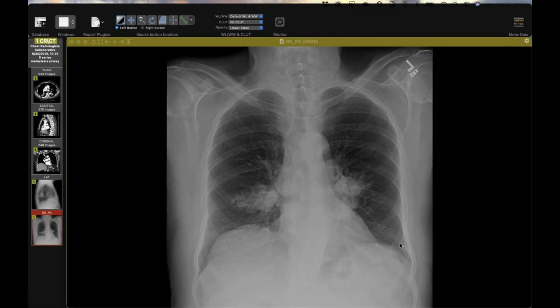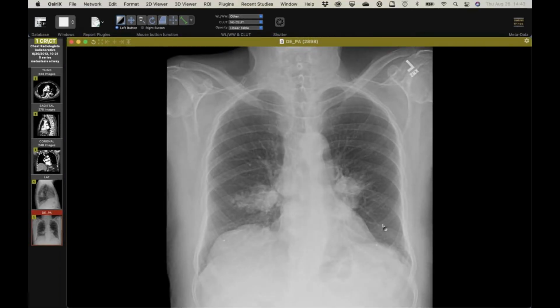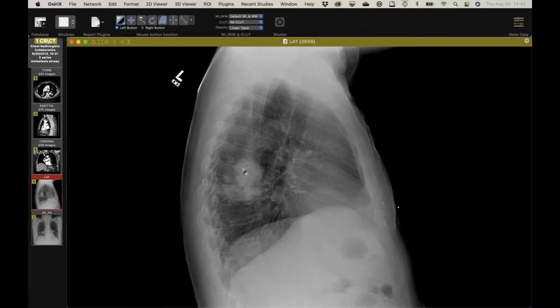All right, you see a chest radiograph here. So this is an elderly person who presented with shortness of breath and abdominal pain. Don't remember all the details, but you can see the frontal radiograph is very abnormal. There are these bilateral perihilar masses, very discrete, sort of branching from the hila, almost look like lymph nodes, but a little bit more irregular. And then on the lateral, you see it's flipped backwards, but you can see they're more posterior located than the hilum. So there's some kind of interesting bilateral masses in the lung.